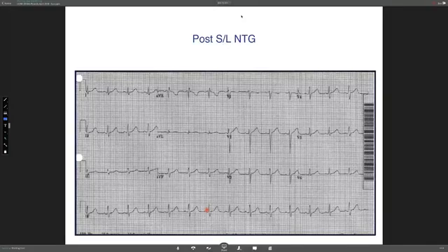However, if the patient is symptomatic, then there may be a need for investigating. But I agree, a short PR interval alone without evidence of delta wave or pre-excitation in a young patient is something we commonly see these days. But I think there is another question for you, which is a very good point actually: has she had a 24-hour tape for PVC burden after her intervention?